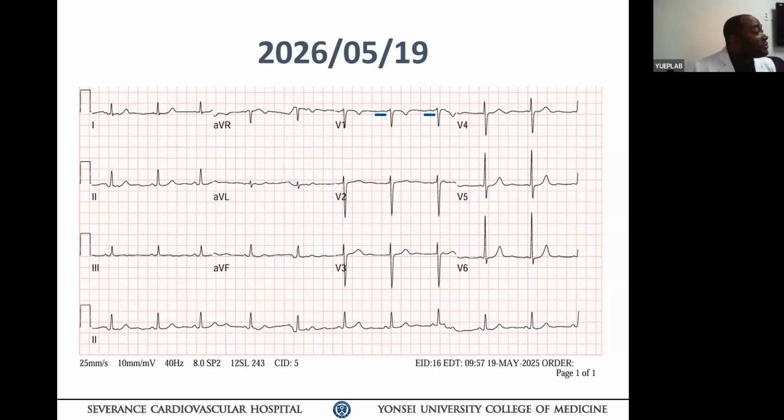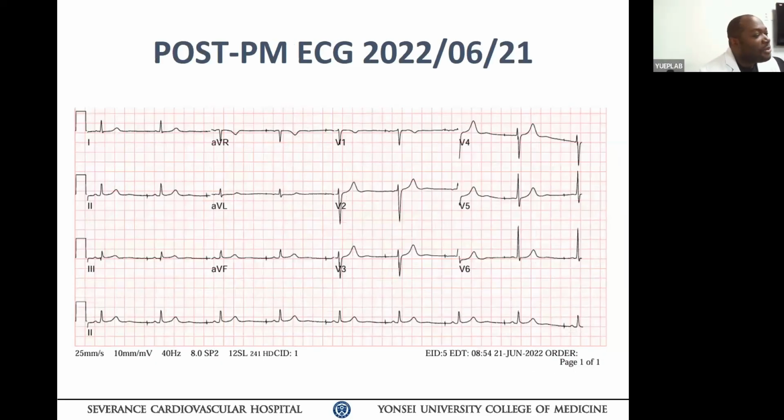So the patient in 2022 had a pacemaker put in for sinus node dysfunction. And so this is an ECG immediately post pacemaker implantation. Is it a bipolar lead programmed bipolar? I think so, not unipolar, but bipolar. You see that big sharp spike, the energy output is programmed very high, or why is there such a striking spike?